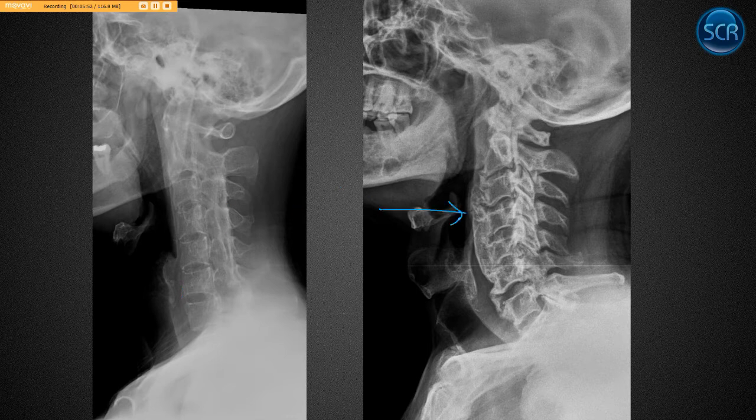And then we look at this one. In this case, we have again that very enlarged hypertrophic ALL calcification, which is very characteristic, open facets like we mentioned, but we have to be very careful when someone has DISH to make sure we're looking at the PLL, because ossification of the posterior longitudinal ligament is very common in DISH. And so we look back here, posterior to George's line like we mentioned, right?